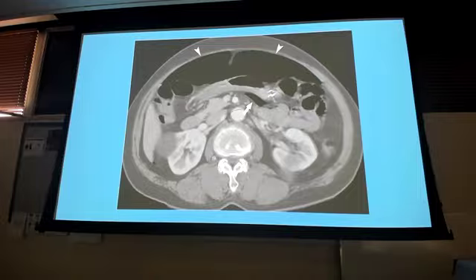What's this? That's the aorta. It's not the esophagus. What's this? What side of the body is this on? So what is this? Liver. Right? Remember, liver normally goes down past the 12th rib. It's normally down there by the kidneys. And if you were like, hey, is that spleen or not? Well, what side of the body is it on?